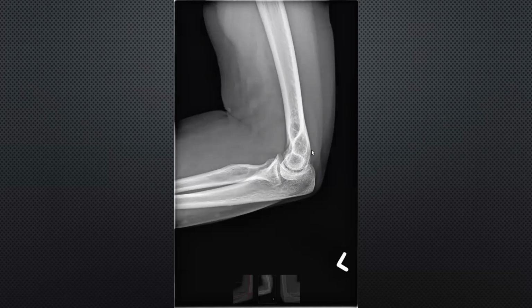Regarding adequacy: adequate, yes. Adequate for the elbow joint, because you can see the humerus, the ulna and radius, the soft tissues. It means adequate, right? Alignment normal? Yes. Alignment means the anterior humeral line and radiocapitellar line, easy? Okay, and what about the bones? Normal.